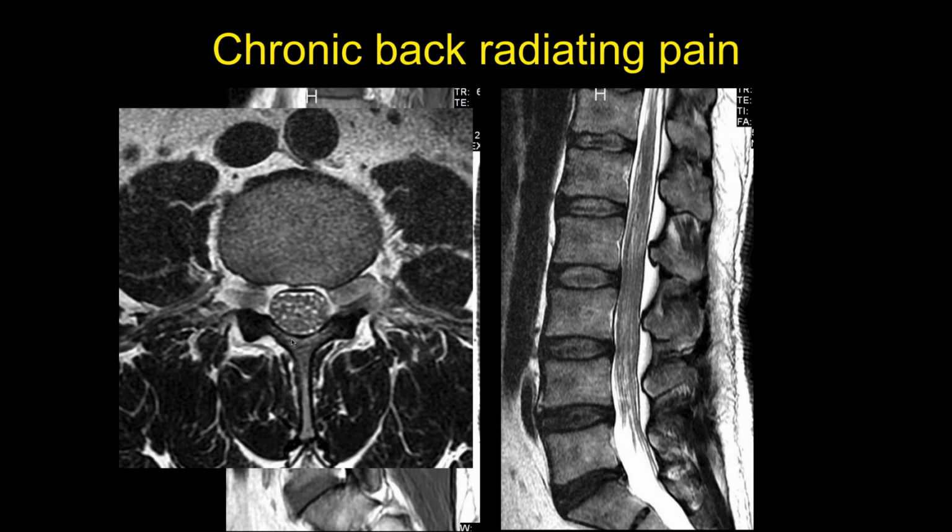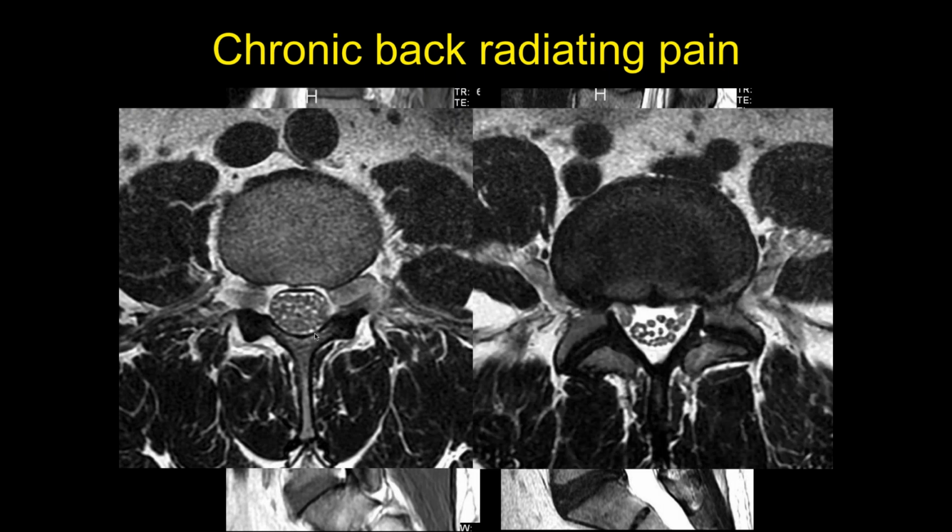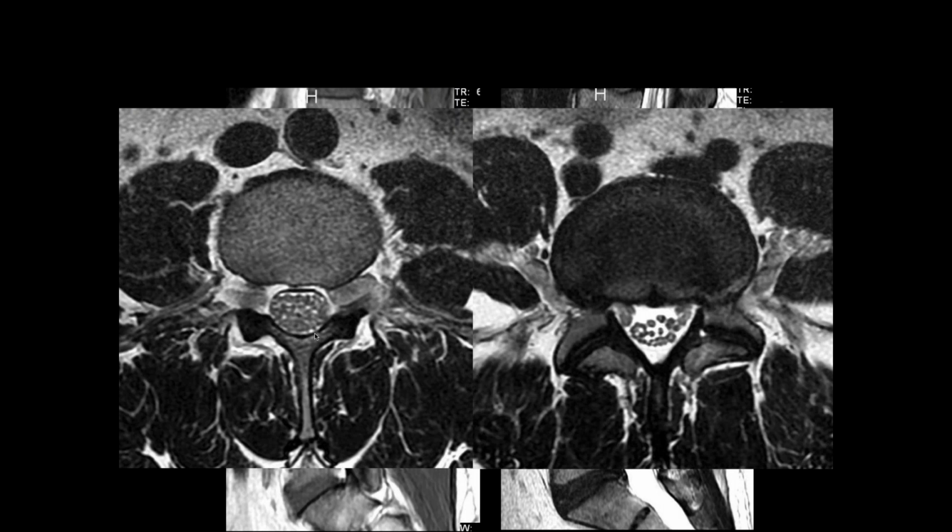Do you think all of these are schwannoma in the thecal sac? No. The nerve roots, the thickening, I would think arachnoiditis. But arachnoiditis causes clumping of the nerve roots. It doesn't cause thickening. That's true. It's chronic pain. Let's see, a little farther down. I don't know if neurofibromatosis could do that. I know that you could have neurofibromas normally, but I don't know if it could cause diffuse thickening.